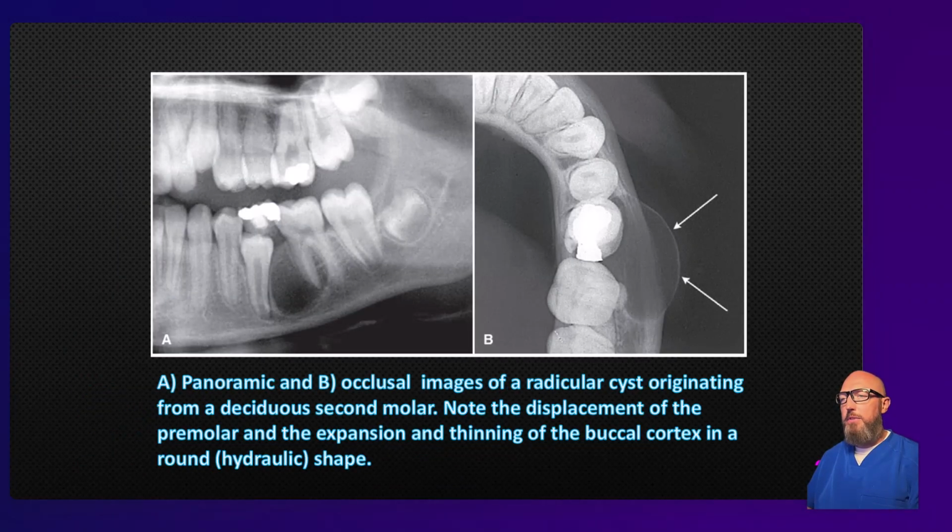Another few examples. Where did this periapical cyst come from? Does it look like there's caries or something going on with this first molar? Or is it residual from this now mostly erupted deciduous tooth? So this looks like a well-defined round corticated thing, maybe starting to lose some of the corticated borders, but likely a periapical cyst from that primary tooth.